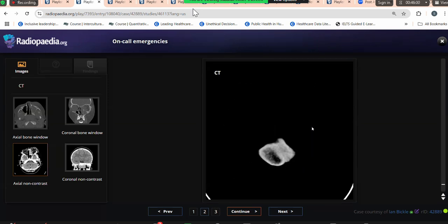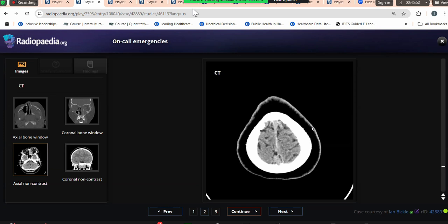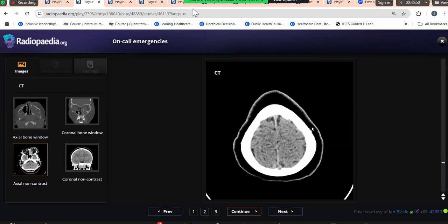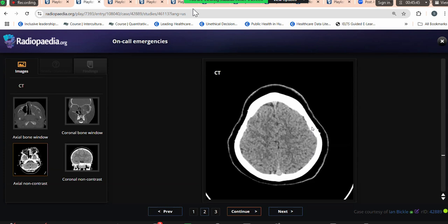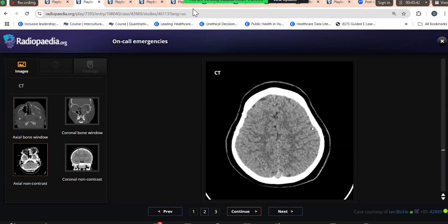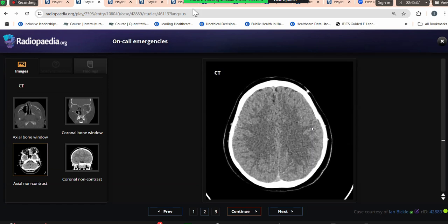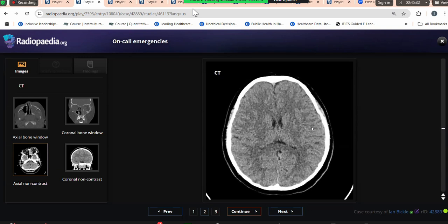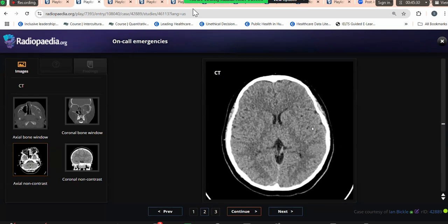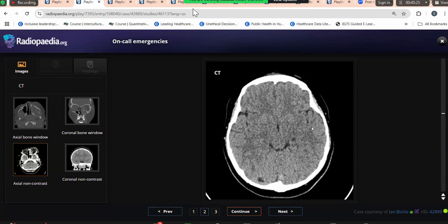Axial section CT scan of an 11 year old patient who has presented with the history of left orbital swelling. I would be scrolling all of the available study and then describe the findings. In the brain parenchyma, I cannot see any focal abnormality or any loss of gray-white differentiation. The falx is in midline, and the lateral ventricles are not dilated or do not show any fluid levels. And the extra-axial CSF spaces so far do not show any abnormality.